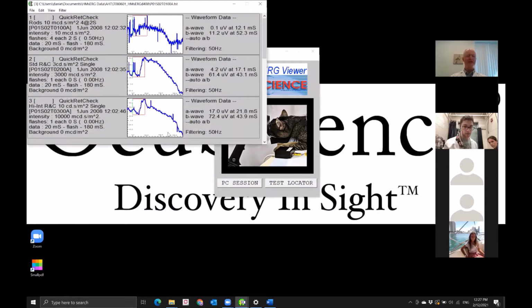Yeah, this is an example of a quick and dirty quick ret check, which looks really noisy, and is there really any data in that? Well, let's see what we can do on this. Then I'll come in and show a little comparison. When I'm looking at data like this, can I make it look better? Can I make it have more analytical sense? Well, let's start off by cleaning up this data.